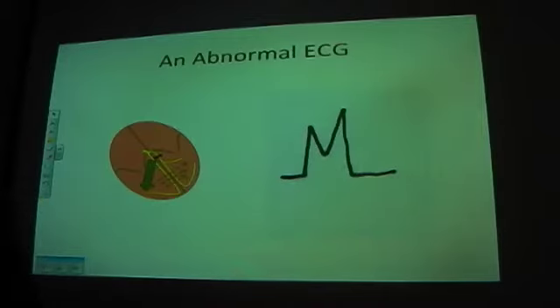Again, if you try and move this physiology onto an abnormal ECG, here we have a picture of someone with left bundle branch block, and they've got the classic RSR wave. What's happening here is you're getting the ventricular depolarization of the right side happening quickly because the electricity is moving along the Purkinje fibres. They conduct electricity really well, so you get a quick depolarization with that.